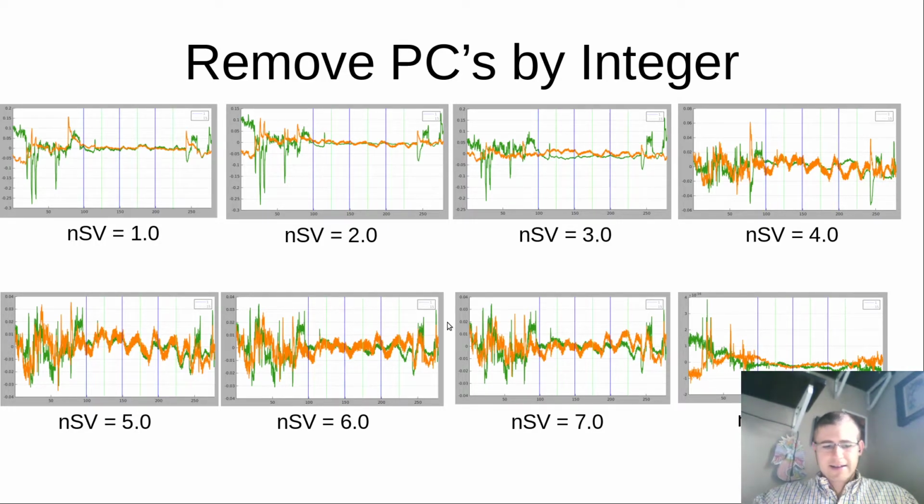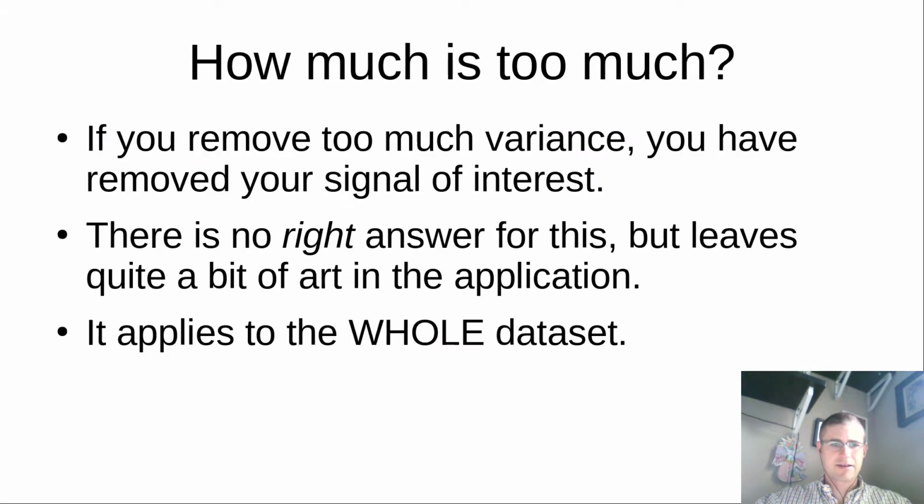I don't know if I can instruct anyone with any form of confidence as to what values are the best, but I'm sure there are some individuals out there who can help, and I'm also sure it has to do with the data set that you're dealing with. So on that note, how much is too much? I don't think there is a right answer to this, but just make note, this is applying to the entire data set.